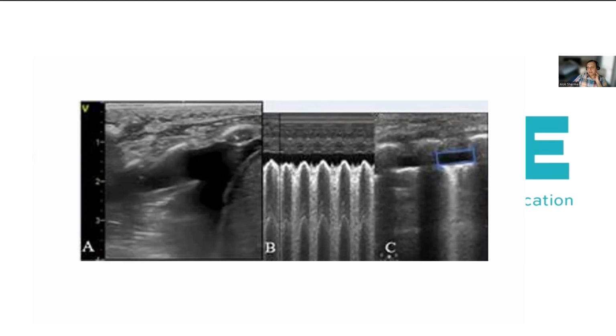But more importantly, there are certain signs. I'm just going to demonstrate to you on a simple image using my laser pointer, that these are the ribs. This is the diaphragm. This, from our perspective, is the spleen. This is the left side of the chest. And really what you can see is compressive atelectasis of the lung here with a lingular kind of appearance, which is what we call the jellyfish sign. But this entire anechoic area that you see in between is the pleural effusion.